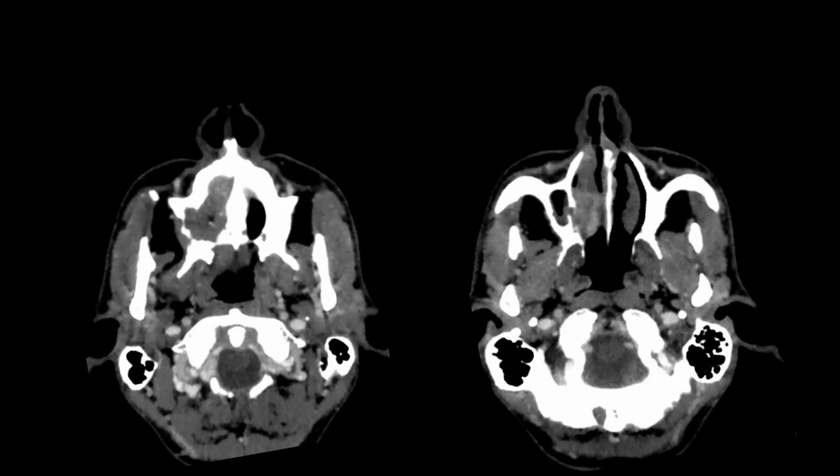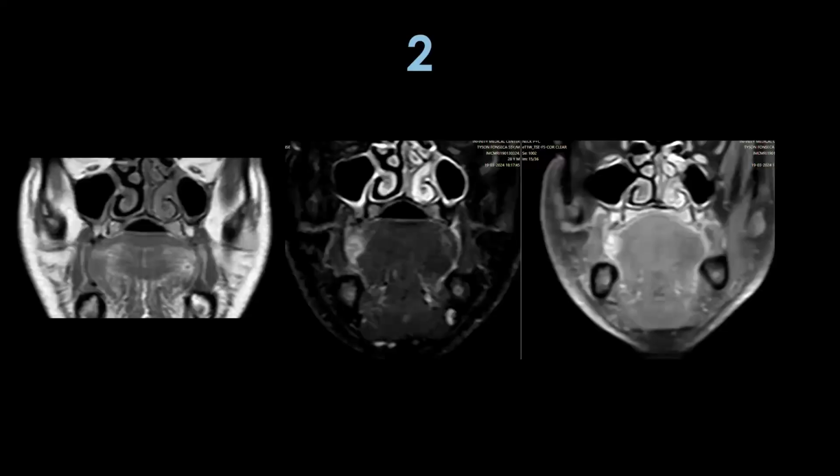Yeah. It's good. This is the next case, a simple case again. There's a right side lateral tongue lesion. What sequences are these? First is T1. Yes. Second is T2. Third is post contrast T1. And any extensions of the lesion? None, it is just the right lateral tongue. The floor of mouth is free. Yeah. Early.